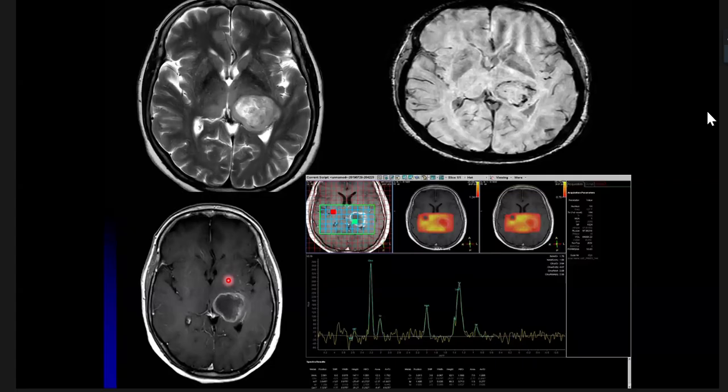Blooming hemorrhagic mets are more common than that. That is fine. So now, I am telling that this lesion can be a primary tumor, this lesion can be a solitary metastasis, or this can be a solitary lymphoma. Just tell me one thing: what you would like to do, given that you ruled out everything.